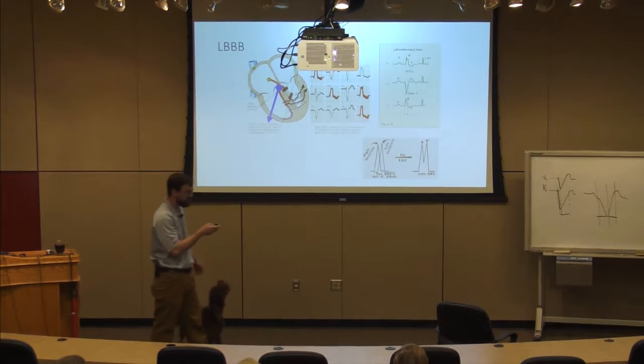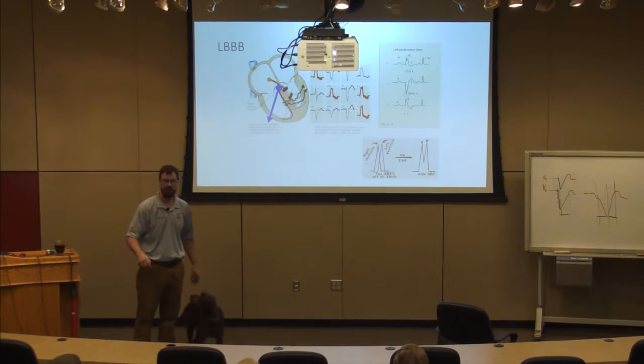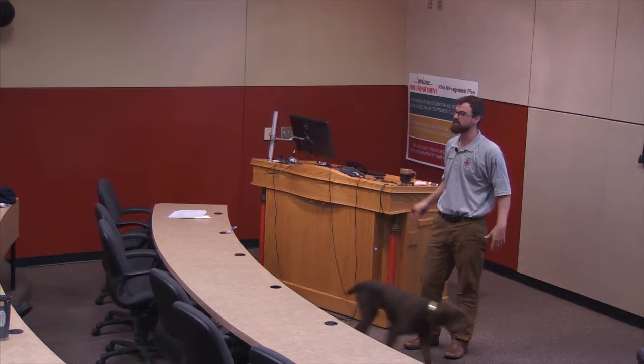Now the beauty of most EKGs is that you end up with a dominant sign and then a supporting sign. For ST elevation MI, ST elevation is the dominant sign, and my supporting sign is that I end up with reciprocal changes. Or if I have diffuse ST segment elevation, that makes me think pericarditis.